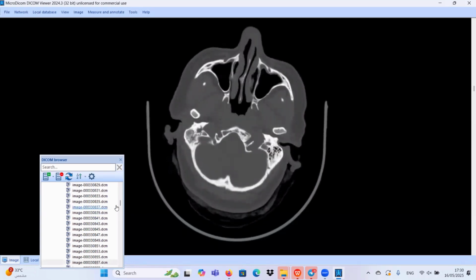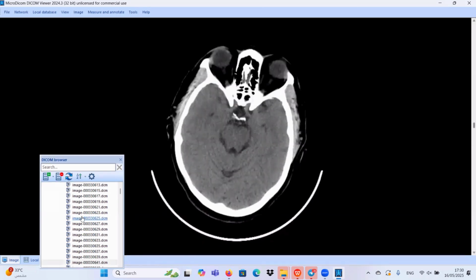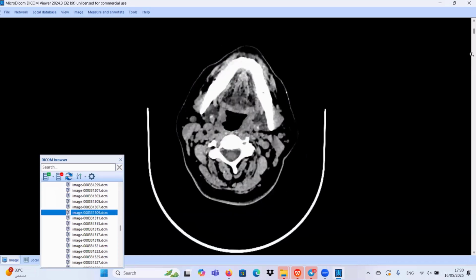Okay. Let's return back to the soft tissue window. So there is mild asymmetry in the oropharynx. Yes, sir. You can scroll with me.